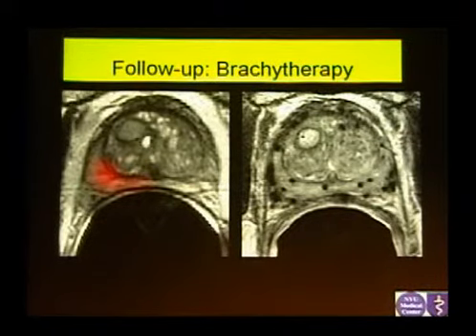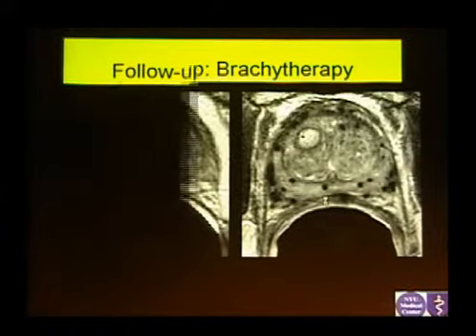Sometimes these patients can have weird locations like the urethra. They can have seed implants in the neurovascular bundles also. It's always embarrassing to say that in the report, but it could be the origin of the patient's pain sometimes. And you see clearly that there's no choline left after seed implantation.